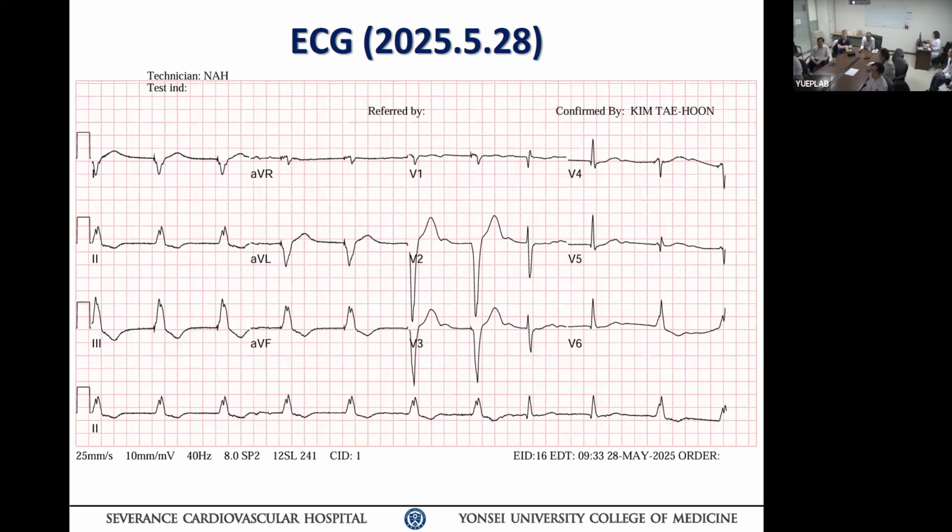Okay. So then subsequent takeover, same QRS complex, the pacemaker took over. So what you can conclude is this is a single chamber pacemaker, possibly rate responsive, and then sensing is proper. If this is the programmed rate of the pacemaker, you can confirm that by interrogating your pacemaker, cross-matching with this, to make sure that your pacemaker function is normal.